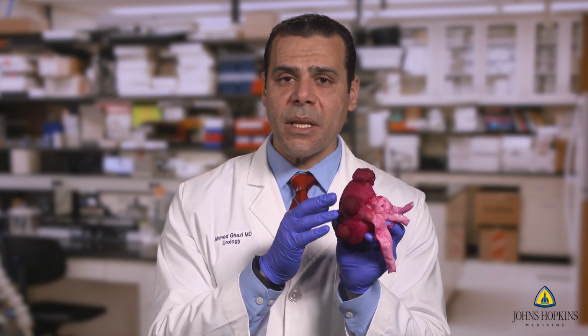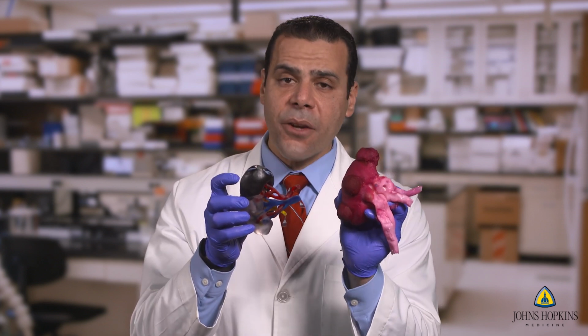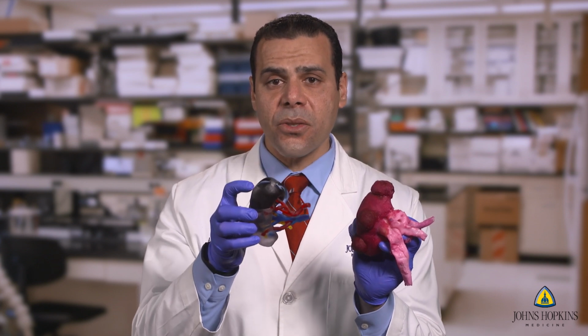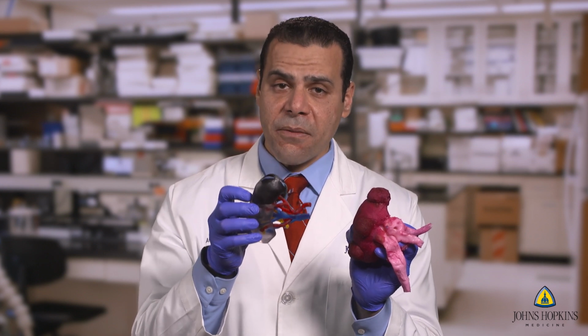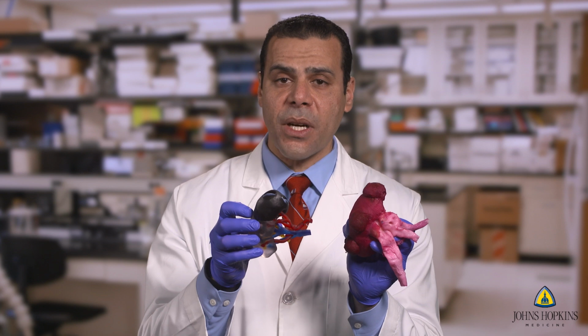But what's more important than this is we're able to use other patients' CT scans to develop patient-specific models. These are models like this one, where we're able to have very complex tumors recreated in hydrogel form, where the surgeon is able to actually practice the surgery, what we call a surgical rehearsal, prior to the live procedure itself. And this we have found to thoroughly reduce complications related to these complex partial nephrectomies.